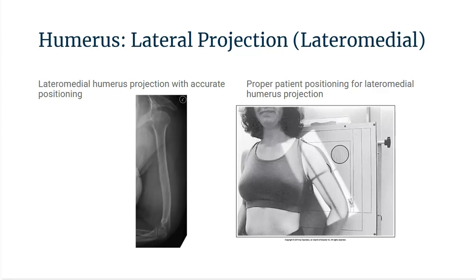In the subsequent slides, we will take a closer look at that particular positioning error, so you get a little bit of an idea of what that looks like. This projection here is a projection done with accurate positioning.